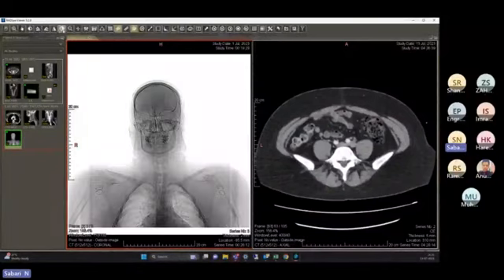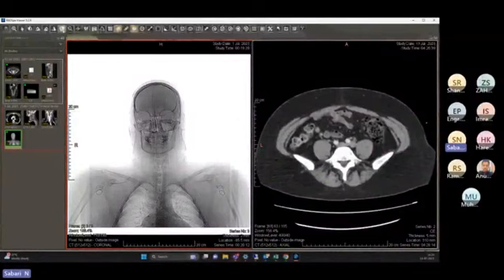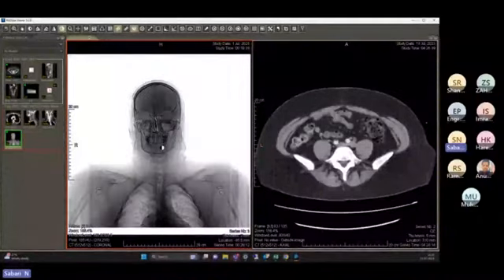And invert. Most of the hospitals still have, for each and every radiologist, referring physician, or OPD doctor or consultant, a film box, which has a white tube light installed in the background behind a white screen. It's called a film box. The radiologist inserts the film there and can view it clearly. Most of the hospitals still use that function because the doctors are addicted to it.